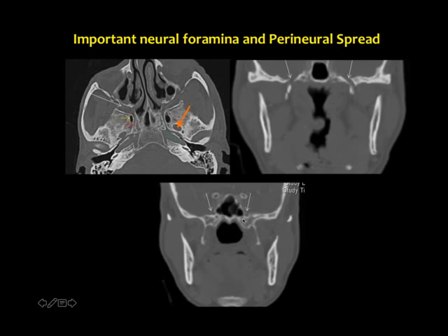On the coronal section, with the medially placed structures, this is how the coronal view would look. At this level you see the sphenoid sinuses and the nasal cavity opening into the nasopharynx proper. In this section you have to identify a few important landmarks again. The first and foremost is the optic canal, the superior-most part, like an inverted cup placed over here.